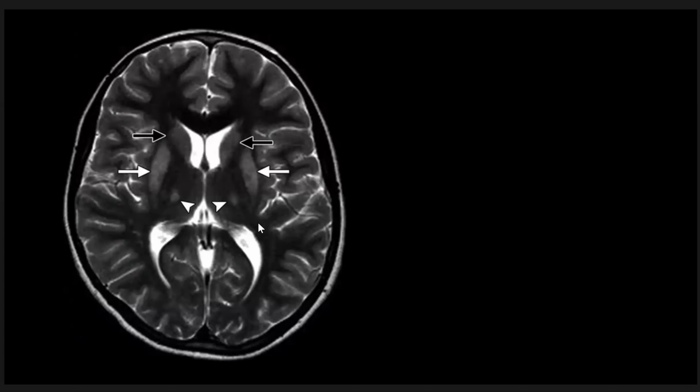And this patient with Wilson disease has more involvement of the putamen, but other parts of the basal ganglia can be involved, as in this patient with caudate nuclei and part of the thalami involved.